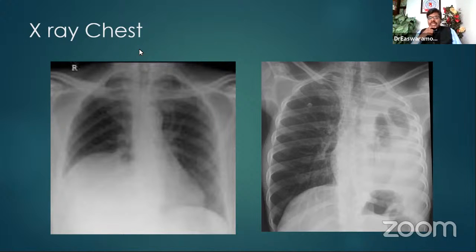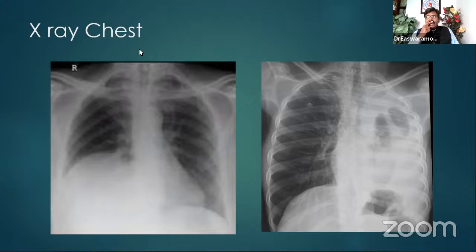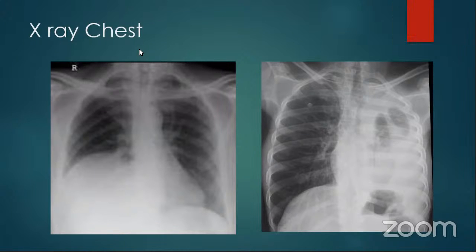Then I am seeing the X-ray, and Ajit Kumar, you are also seeing the X-ray with me. So what do you think this patient probably has? Can you try to unmute and try? Diaphragmatic hernia, sir. What made you tell diaphragmatic hernia?